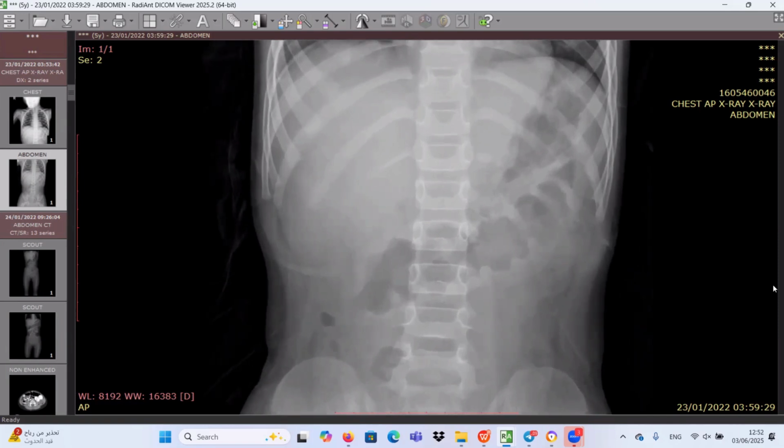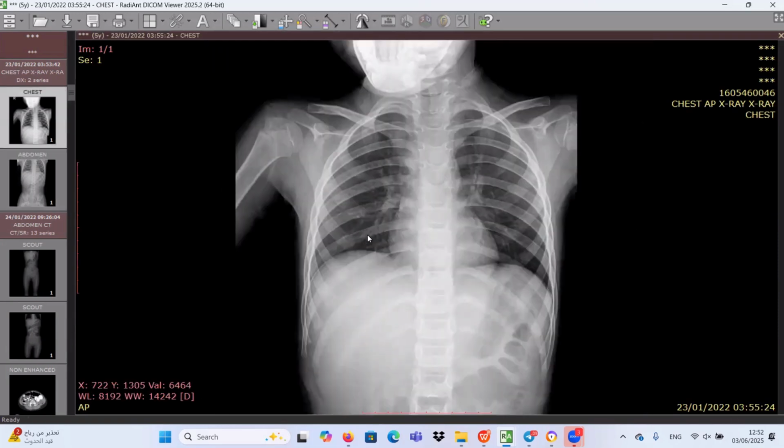Very nice. Very good. So you got the idea now. We have some thumbprinting, as you said, along the transverse colon. And it was present here at the edge of the film, as you see here. My remark here for all candidates who will go to the FRCR exam: the FRCR exam is not difficult, but they play on the edge of the film. Maybe a simple case, but the modality is not diagnostic for this case, as we saw in the first case of heterotopia, which is easily diagnosed by MRI.